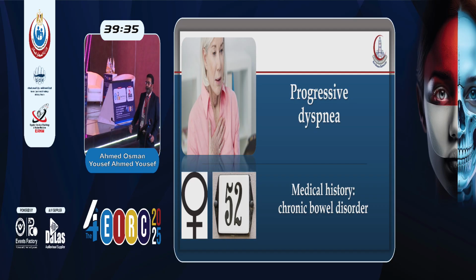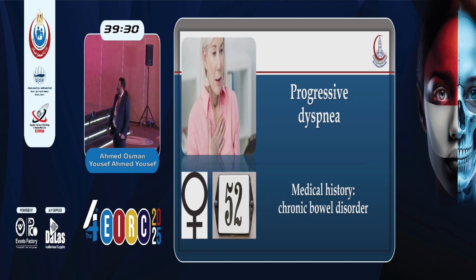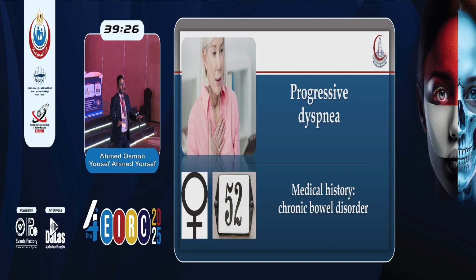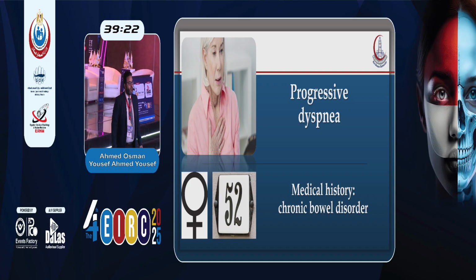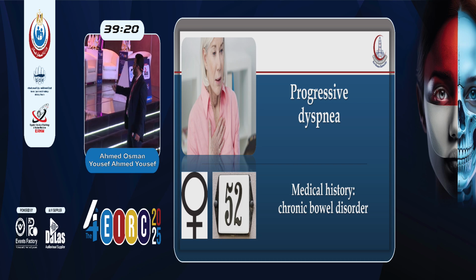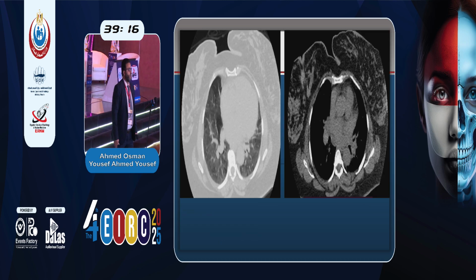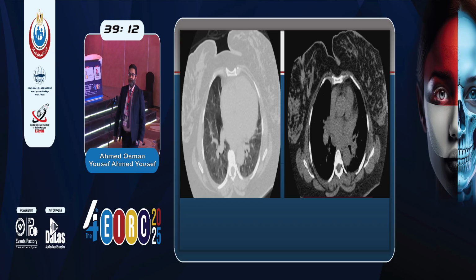This is a female patient, 52 years old, with progressive dyspnea, with a medical history of chronic bowel disorder. She came for CT chest without contrast, and this is the CT chest mediastinal and lung window.